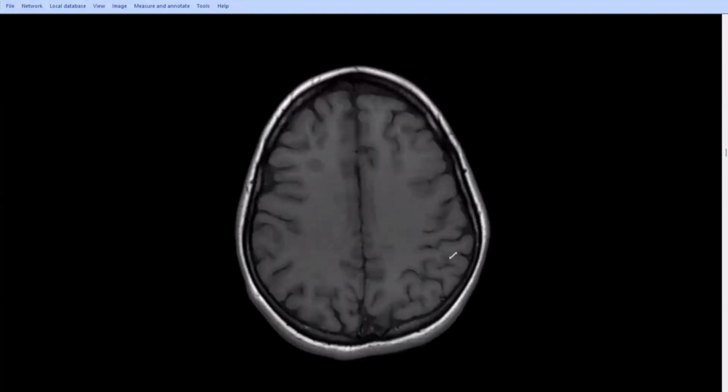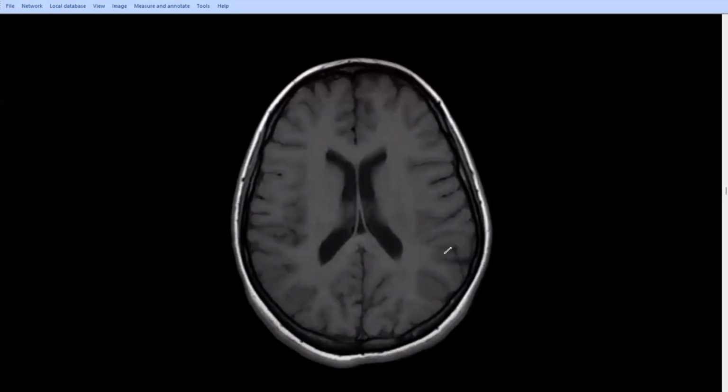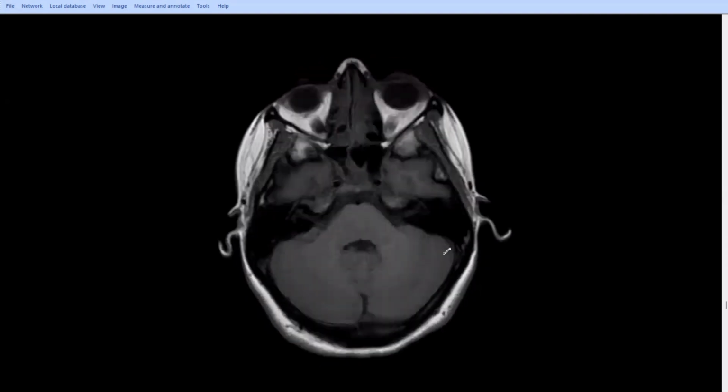In the axial T1 weighted image, the lesions are partially indistinct. We can see some of these lesions, and they display low signal intensity in the T1 weighted image, while other lesions are isointense as compared to the normal signal intensity of the brain tissue. We also have the lesion located at the left middle cerebellar peduncle. It displays low signal intensity. The pontine lesion appears almost indistinct.